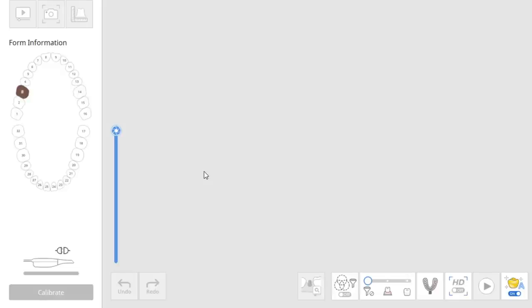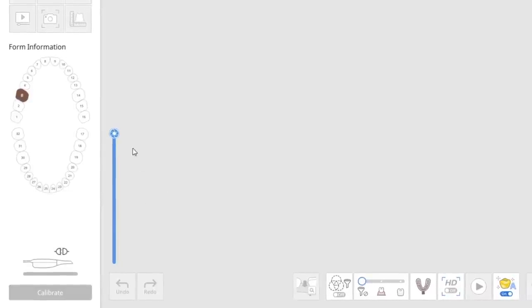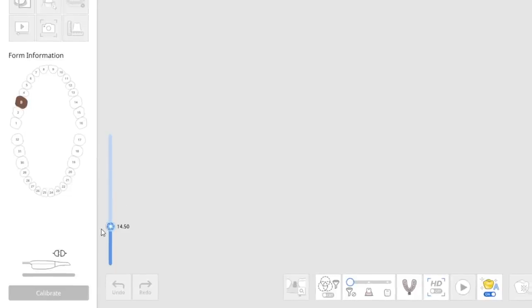You manage that, you can turn this to full throttle and have the camera pick up as much information. But if you're inexperienced and new, you may inadvertently pick up the tongue and the lip, which slows you down dramatically as a user. It gets frustrating. So this tool is very powerful, and you can automatically adjust it to multiple settings.